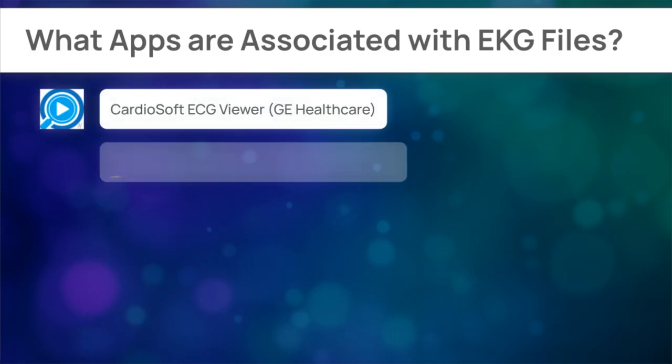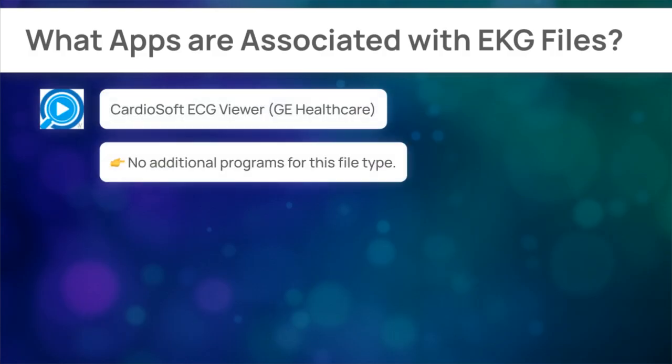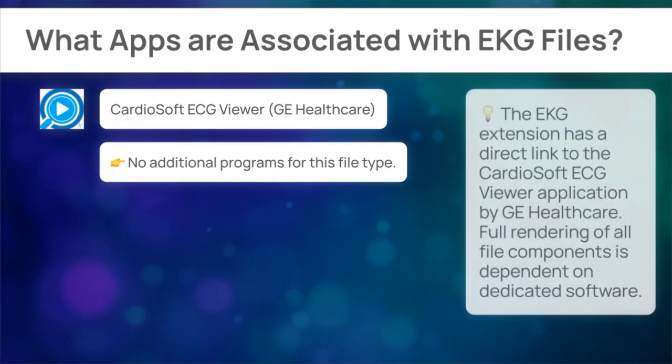Most users will find that CardioSoft ECG Viewer developed by GE Healthcare is the best tool for EKG. Full rendering of all file components is dependent on dedicated software. Windows shows only a simplified view, so deeper interpretation must be done with suitable software.